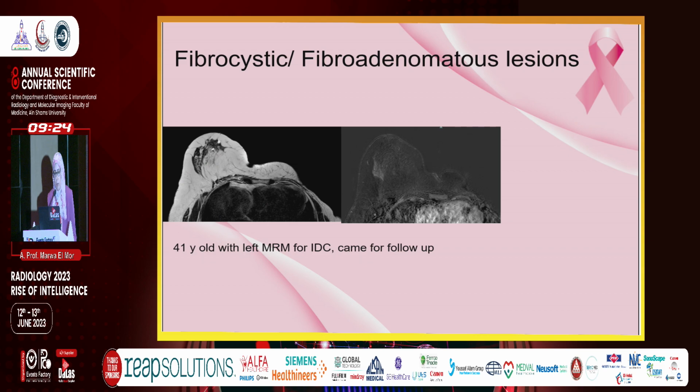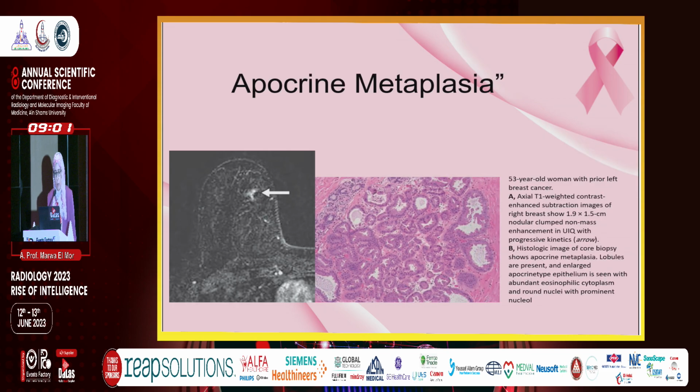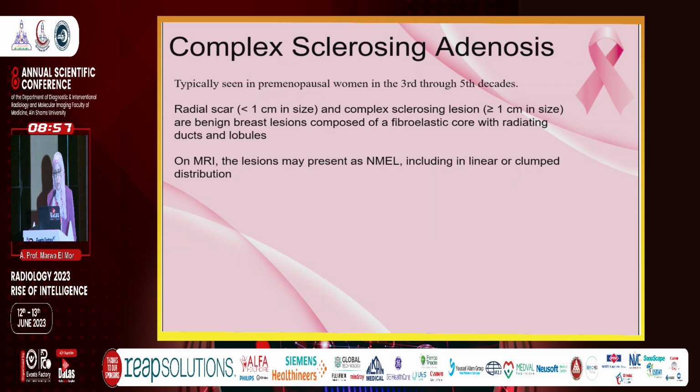On subtracted images, there was regional non-mass heterogeneous enhancement. We referred this patient for second look ultrasound, which was negative. So we referred her for follow-up after 6 months, which showed no change, and this was followed and found to be benign fibrocystic changes. Apocrine metaplasia can also present as non-mass enhancement.